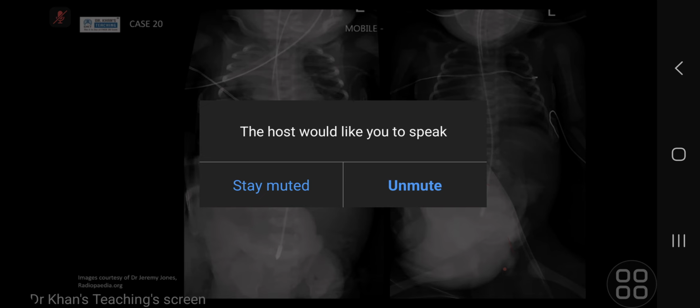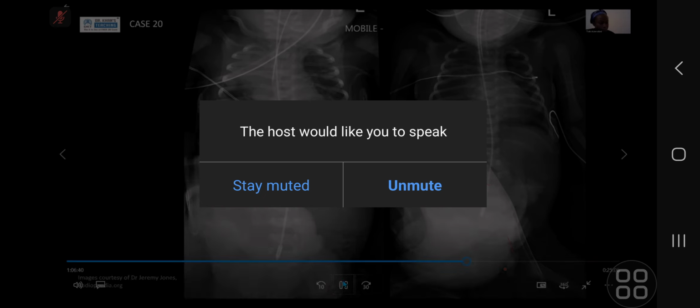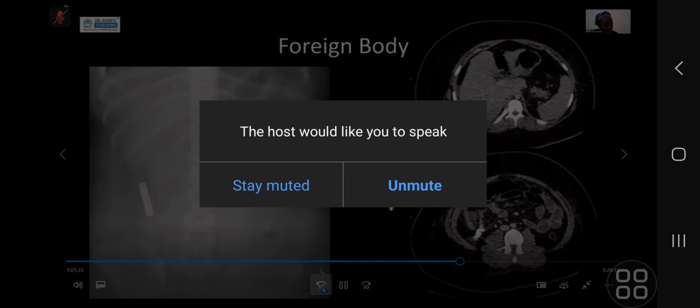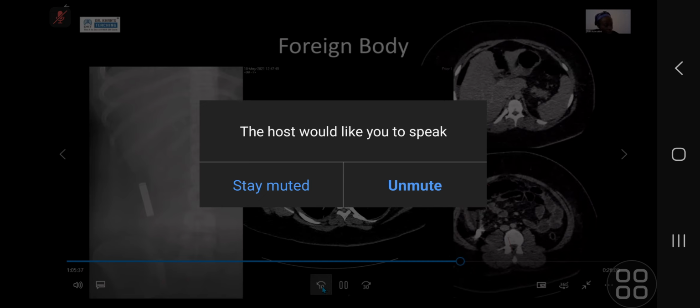These are to select the frontal radiograph of the neonate. The battery here was not moving. It was just staying stuck. So she had a subsequent X-ray, which I've not shown you, which also showed that this battery here was not moving. It was just staying stuck here, and she was clinically deteriorating with worsening abdominal pain and fevers.